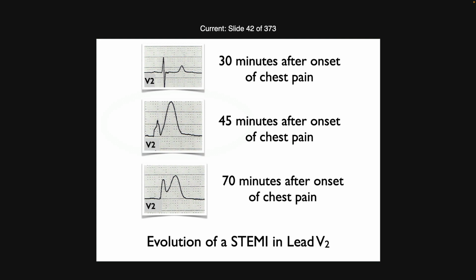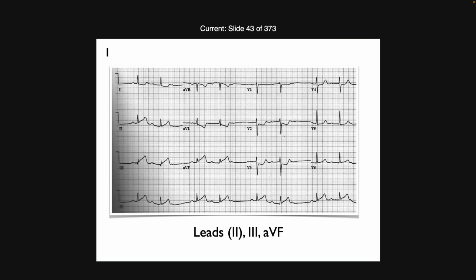Okay, so in your handout, number 1, 2, and 3, it's probably asking if there's close to the 6 millimeter. But more to the point, you can take that QRS and just move it in, and the relative size is really significant.